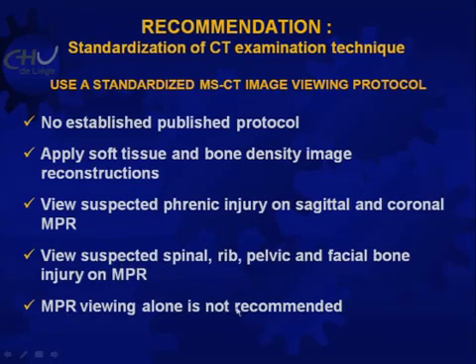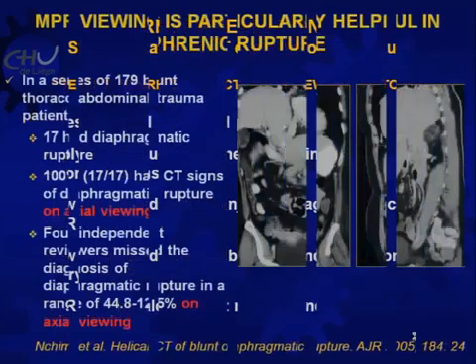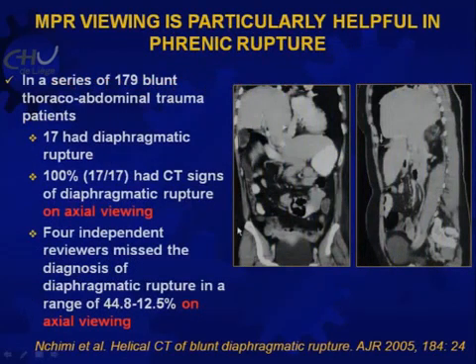So this is a nice example of phrenic injury. You see here the liver, which is high standing. So is this just a high position of the liver or is it phrenic rupture? It can be very difficult on the right side. And only on the MPR, you see that there is a rupture of the diaphragm over there. So it's important to look also at the MPR images.